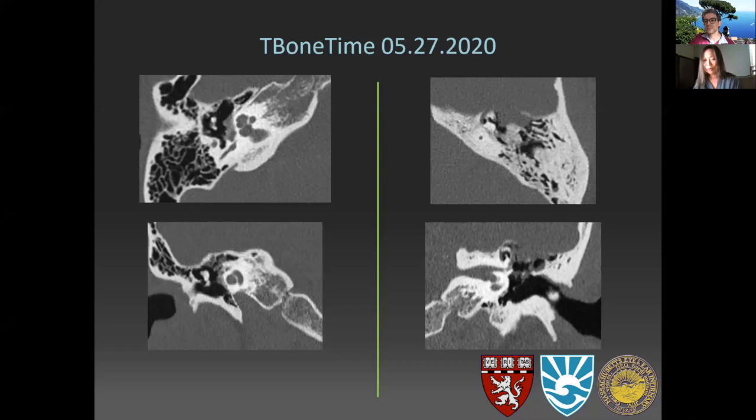It tends to be a little bit less dense, but we see that in the control group. We see that in the group with disease. So I think maybe it's embryologic, kind of like the cochlear cleft, which has been described. So I don't attribute that to pathology necessarily. For otospongiosis, I just look at the areas elsewhere, but I have noticed the same thing you have, which is that right in the middle of it, it tends to be less dense. So we've had to move our baseline sort of normative comparison to a little bit off to the edge.